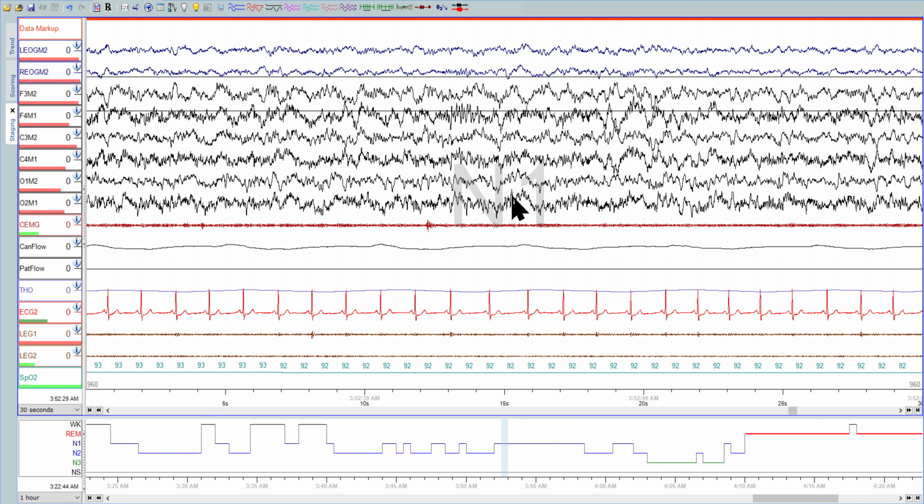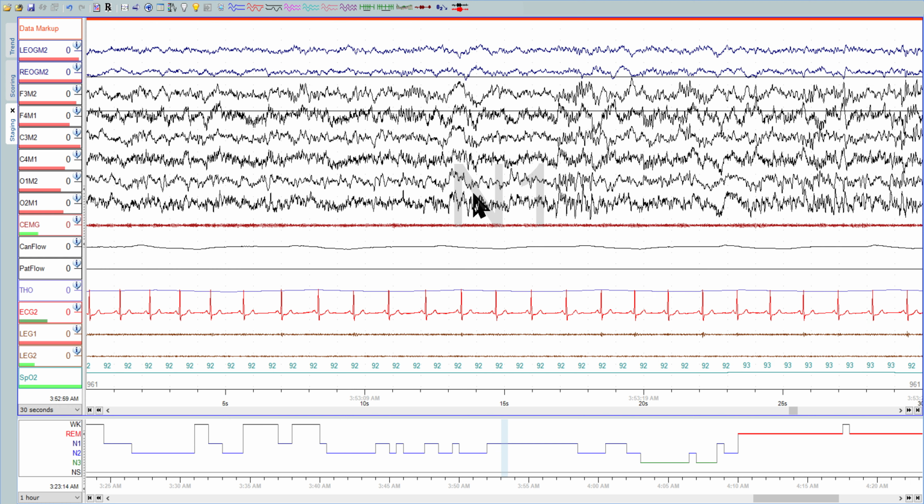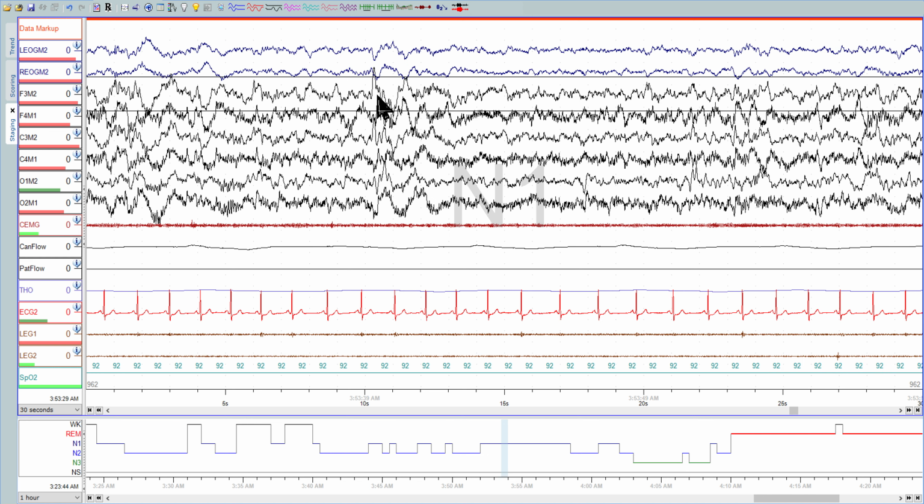Good, good, good. And then some K complexes here.